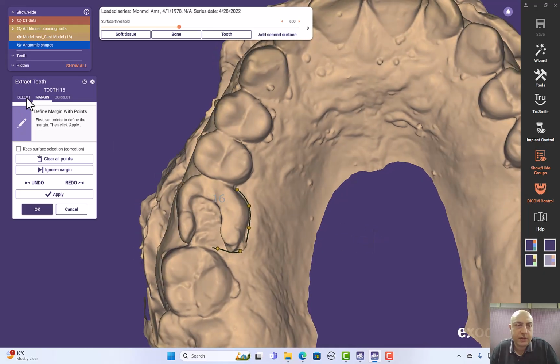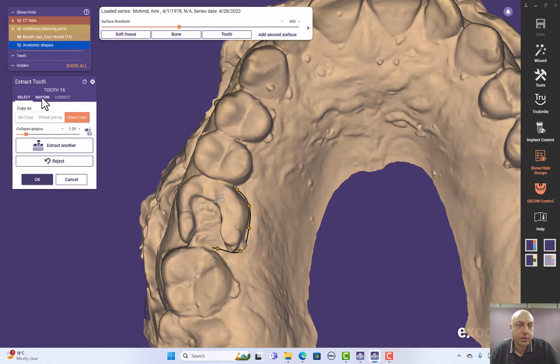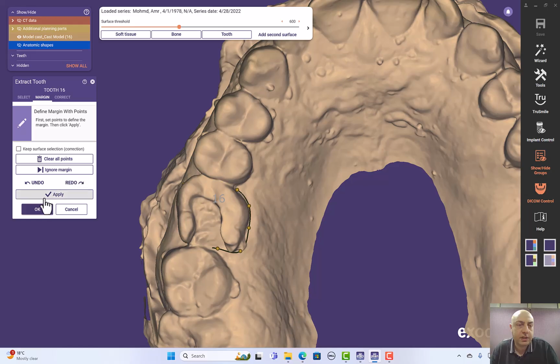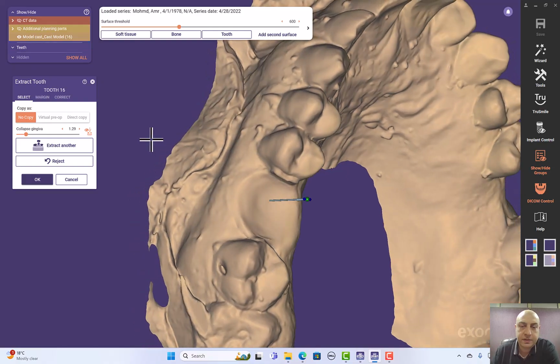So here I don't need this. I will go back to Apply, and I will choose No Copy here.